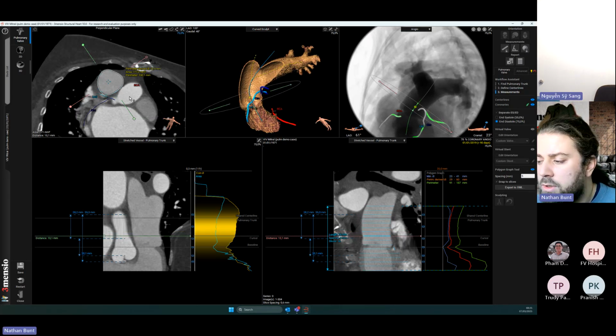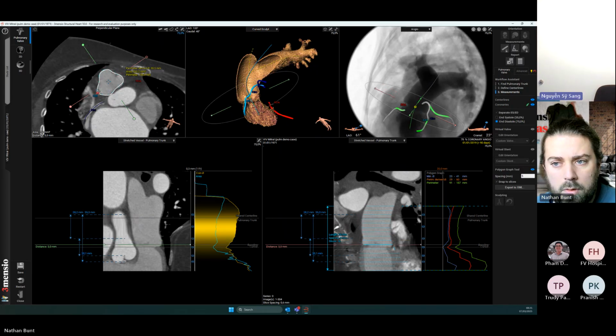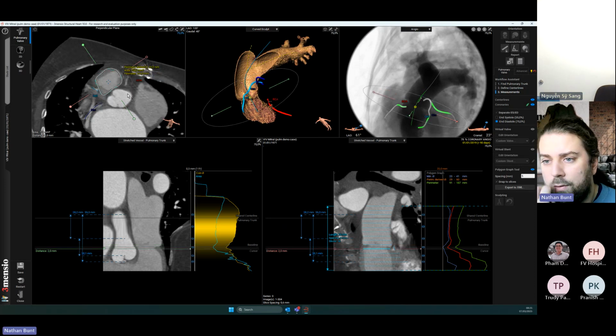Any questions still? No, sir. No. All right. Because I think this sort of concludes the functionalities of the pulmonary valve workflow.